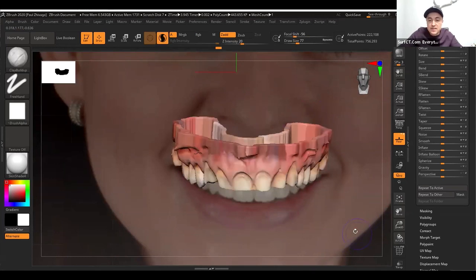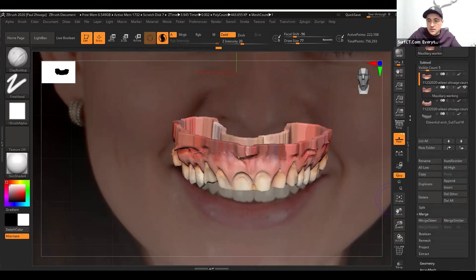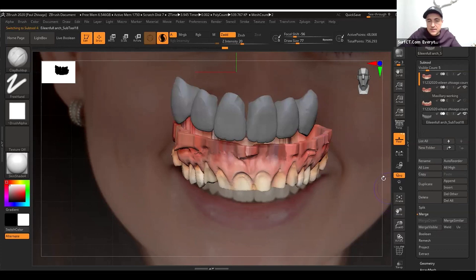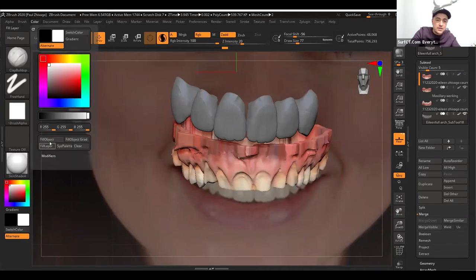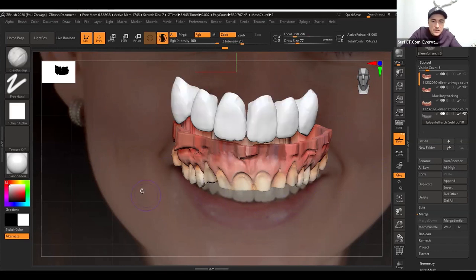And now you unmask it again and you go back to your teeth. You can select the teeth. Let's color them, at least a whiter color. For that, you have to have the RGB channel on. Let's do that quick. Fill object. I don't know, seem not to be lucky. Maybe they're just masks. So yeah, that's what happens. When they're darker, then they might be just masks.